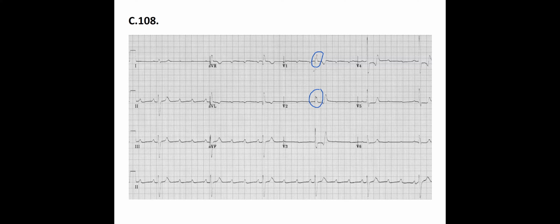Okay, and I see that each T and P overlap here. And then why is it bradycardia? I counted about 33 BPM, beats per minute. Yeah, that's normally, yes, which is a severe bradycardia, and the patient needs a pacemaker right away. Yeah, for sure. Okay, yeah.